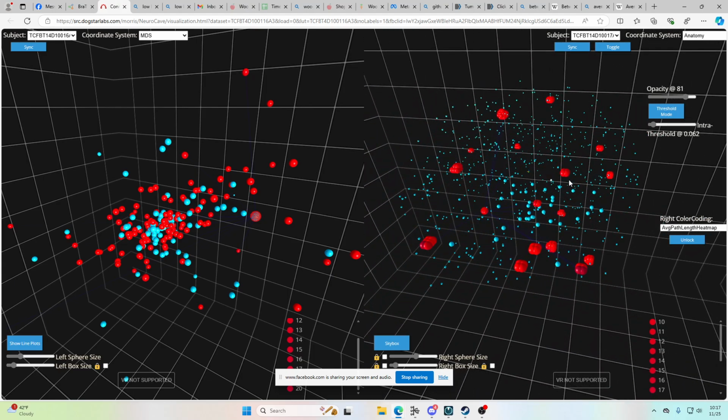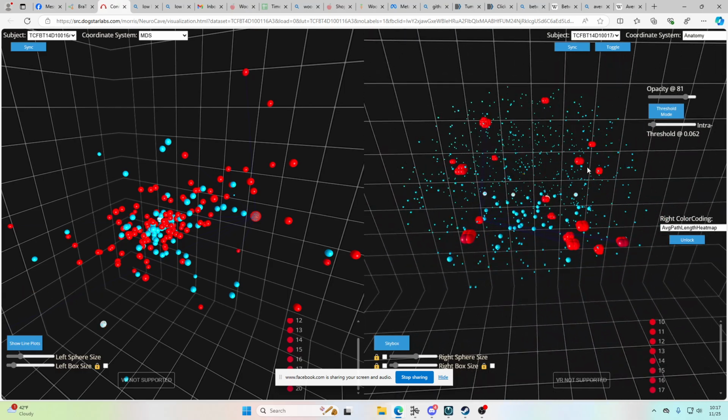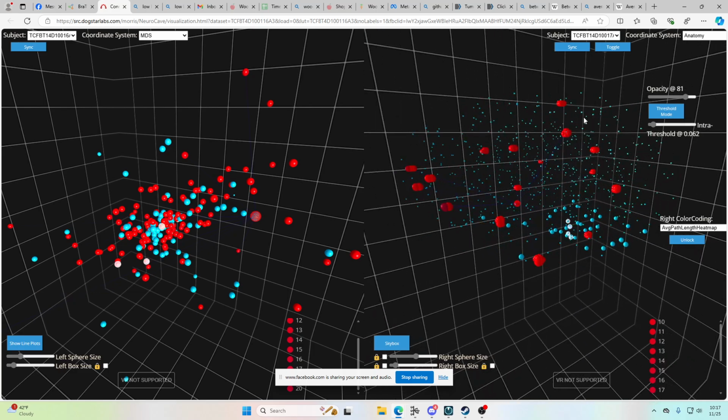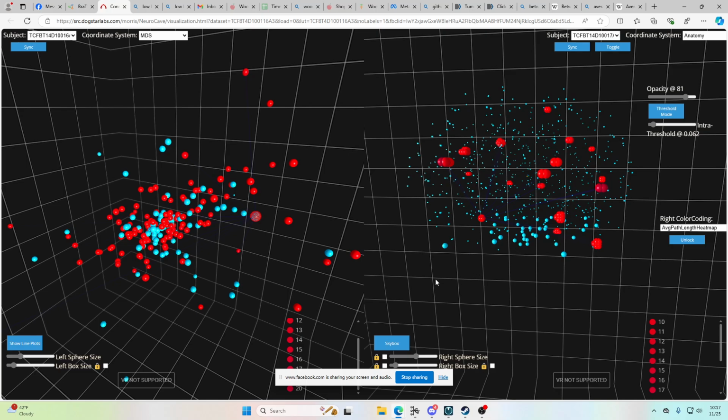This data set is about 256 voxels wide, 256 across, and about 100 deep, which makes about 6 million voxels: 256 by 256 by 98 or 100 or 102. So those are the two different scales. You've got a mesoscale and a macro scale, and I have some other data sets.